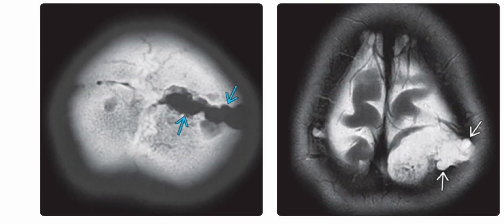Left is the axial non-enhanced CT scan in a patient with a growing skull fracture, and it shows widened fracture with scalloped margins. Right is the axial T2-weighted MRI in the same patient, and it shows a lobulated CSF collection, which is filling the growing fracture. CSF pulsations have widened and scalloped the calvaria.